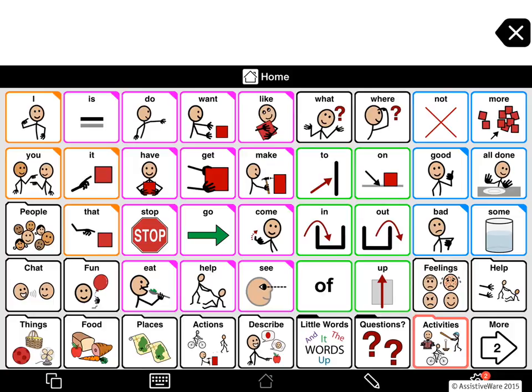We usually say that a person needs about a third grade literacy level in order to meet all his communication needs with spelling and word prediction. But even just the ability to recognize and use initial letters for familiar words is very beneficial. There are no prerequisites for working on literacy other than breathing. Anyone can benefit from literacy teaching activities. It's not in the scope of this video to go into detail on how to teach literacy skills to non-speaking people. However, what we can do is give you some ideas for how to set up Proloquo2Go to promote literacy.